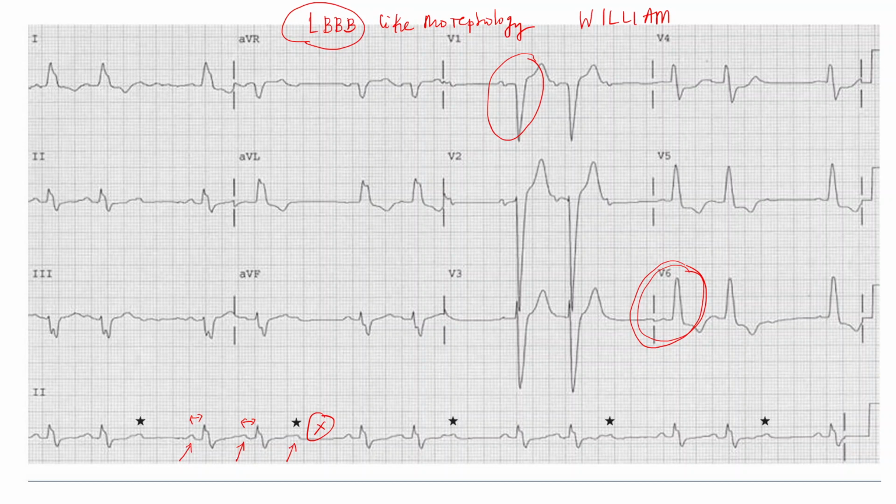And I have already discussed the WPW. In that also, you must be remembering that you have to know the bundle branch block morphology to find out the type of WPW, whether it is type A or type B WPW. So always, whenever you are getting a wide QRS complex, try to find out what kind of bundle branch block morphology.